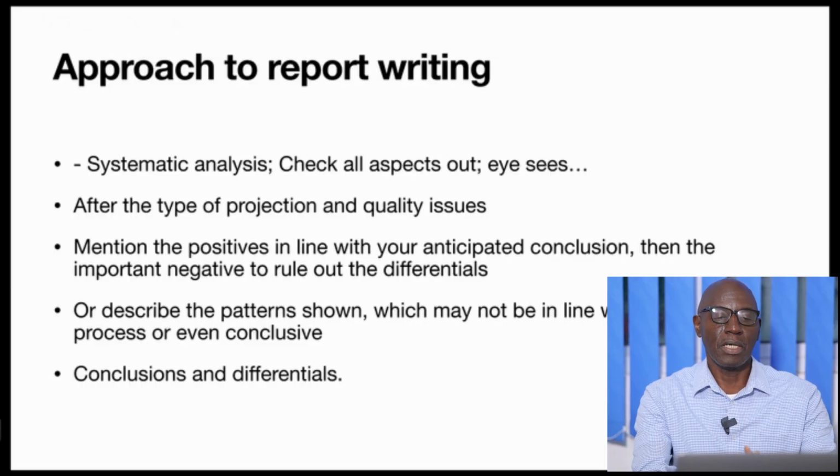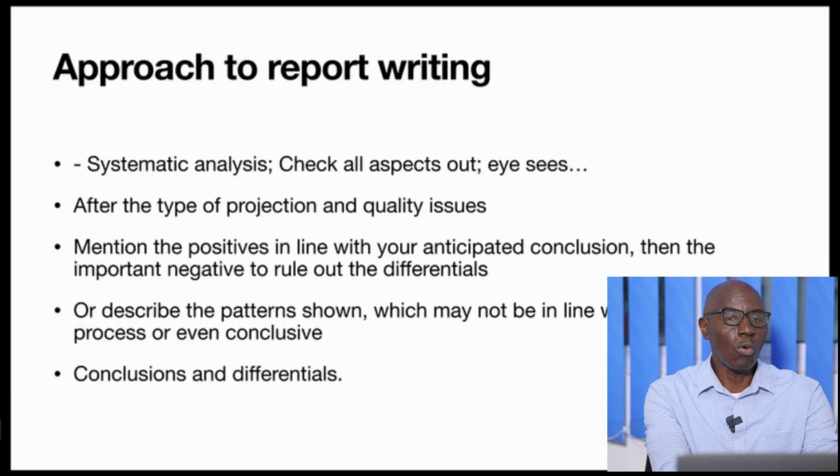What I mean is that I start by looking at the chest wall, going into the pleura, then the hemidiaphragms, and then finally I look at the lungs. I may not write the report in that form, but this ensures that I've looked at each and every aspect of the chest radiograph. Needless to say, before one attempts to interpret a radiograph, quality is paramount. You have to ensure that the radiograph is of good quality, because if the quality is compromised, so will be your findings. So it's very important.